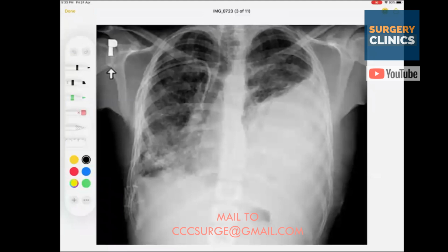Again, what is the principle that I've taught you? The principle that I've taught you is something called as A. Okay, in this one, what is the bad thing about the A that you can see? You can see something, isn't it? Okay, what is that one? Sir, this is the blackness in the lungs. This is normal. But again, I can see many things that are white.